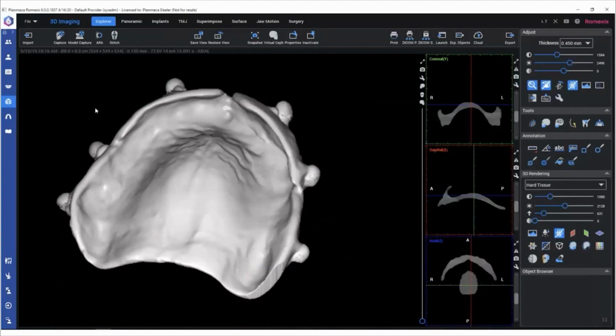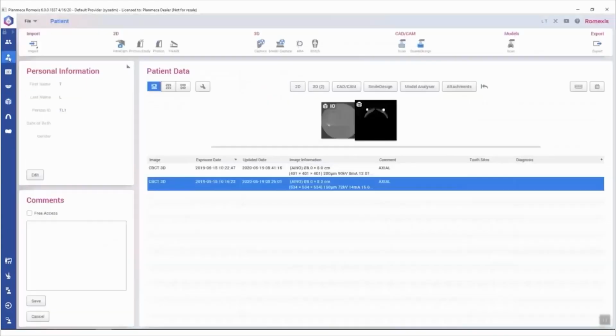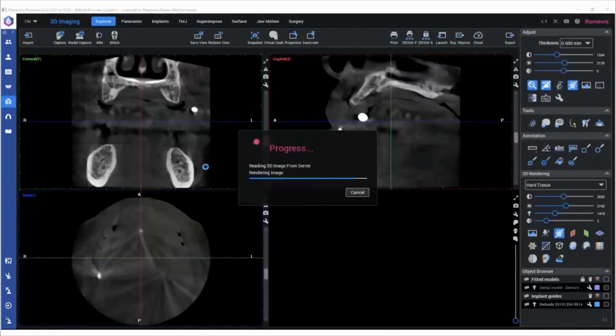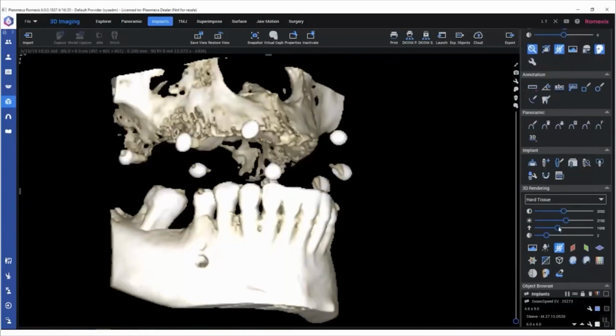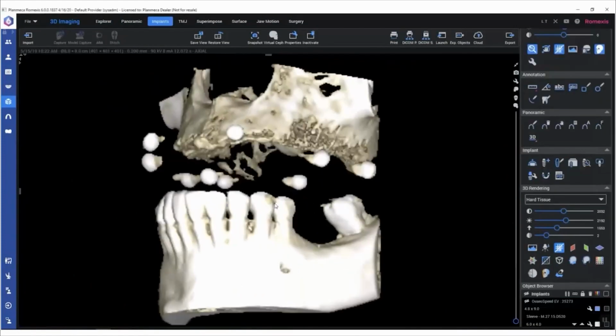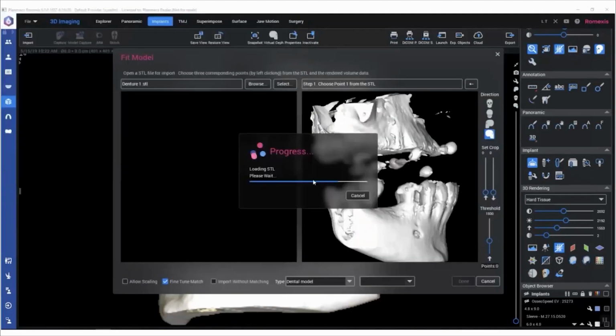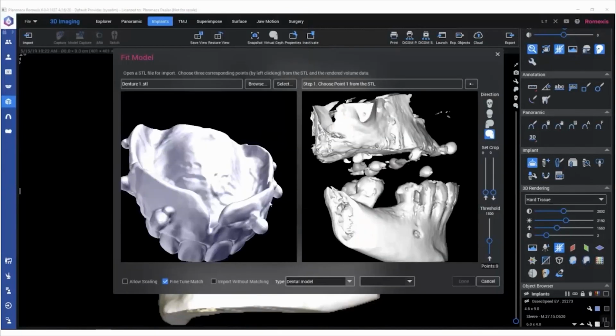But what we're going to use it for is to import this into the patient's CT scan, right, using these common radiographic marker points. And by the way, you can buy radiographic markers from vendors, and those can work pretty well. I found that some of the glass beads that we're getting throw off a little bit of scatter. Here's what we use. We use expired composite. So if you have any lying around your office, just make some 3mm little roll-ups, cure them, and sticky wax those onto the denture, and they work fantastic, we've found.